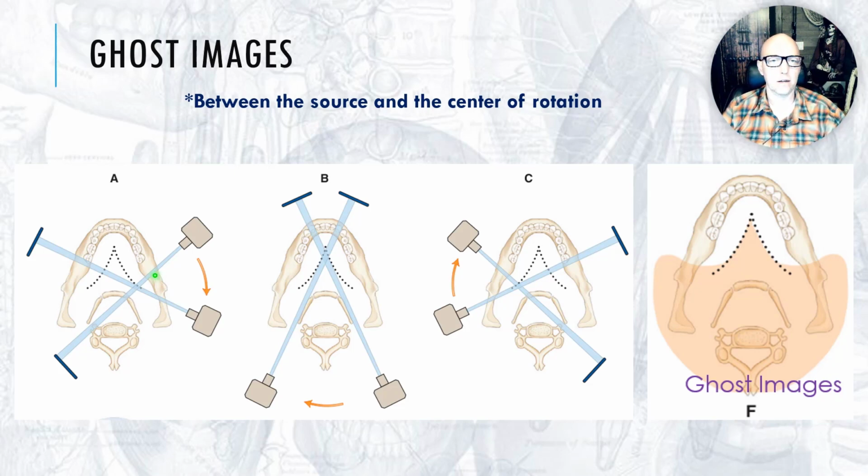And we'll show you that. It's kind of stretched out across the other side. It's higher. Remember, ghosts float. Ghosts should always be higher than the real object. What do you see a ghost image of here when it's imaging the middle of the patient, crossing through here? You see a ghost image of the spine, to some degree the hyoid bone, but you'll also see a real image of the hyoid bone over here.